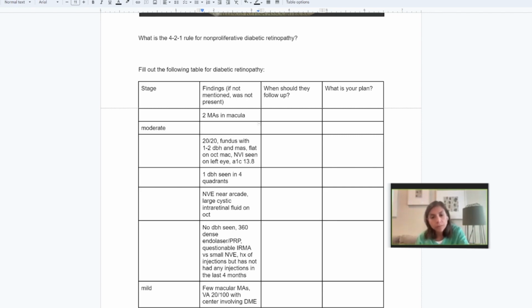Alrighty. For this patient, for me, once they're proliferative, they're always proliferative. So I would call this proliferative diabetic retinopathy status post PRP. What I would do is get an IVFA to try to determine if this is truly active NVE or IRMA. IRMA would not leak. NVE does leak. If on exam I have any doubts, again, mostly on exam you can tell if it's IRMA or NVE.